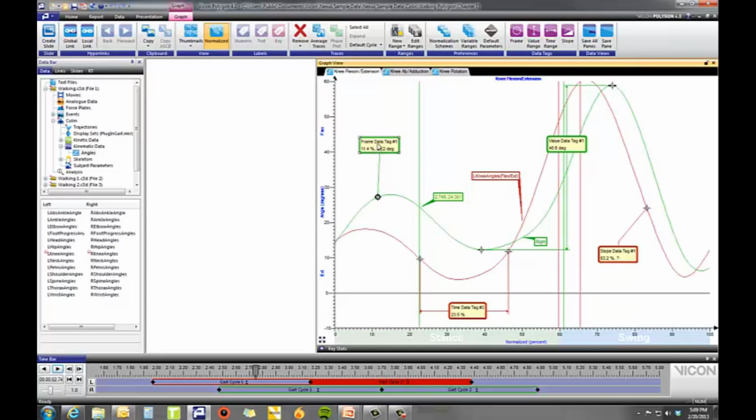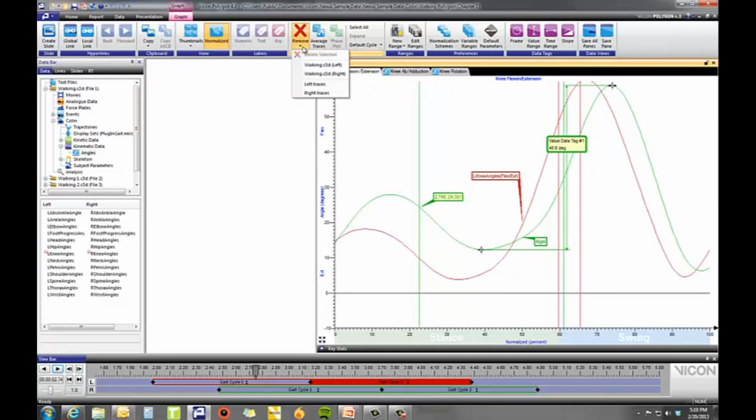Now I'm going to clear some of those out for us. Okay, and you can just clear those either using that right menu, like I said, with delete, or just clicking on them once they're highlighted, pressing the delete button on your keyboard.